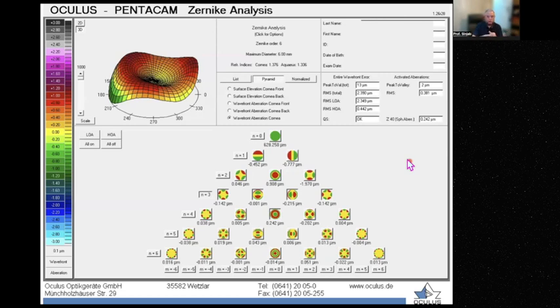Now, these cutoff values, the 0.35 and 0.5, are just for the Pentacam and Galilei, because in both you can select these 5 high order aberrations, but in MS39 and Cyrus, you cannot select. It will give you all together, except the low order, of course. So in this case, we will raise the bar. We will consider it as 0.5 instead of 0.35, and 0.7 instead of 0.5. So just shift it up a little bit in order to accommodate the full high order aberrations, because the machine is built like this.